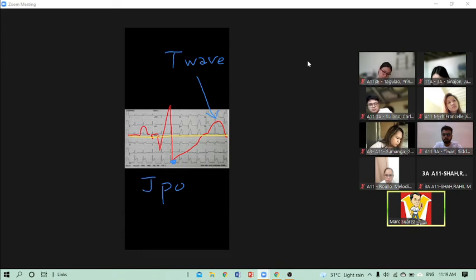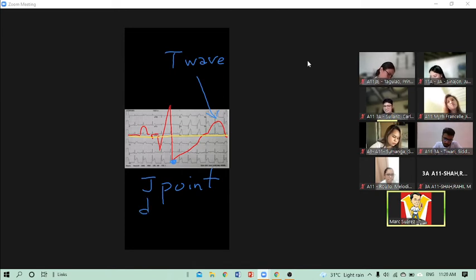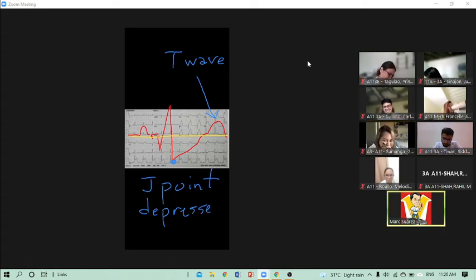So does anyone want to say something about the J point? Depressed, Doc. Lower. Okay. It is depressed. The J point is not happy. Okay.